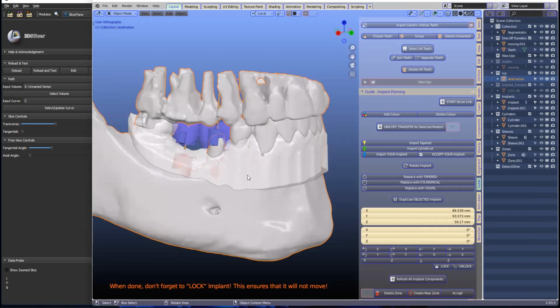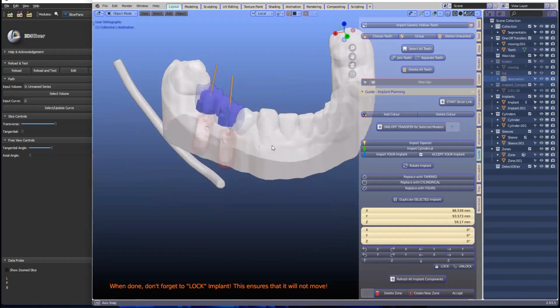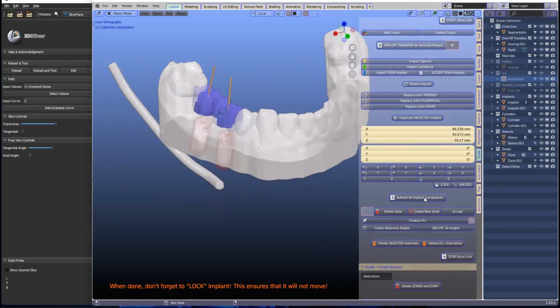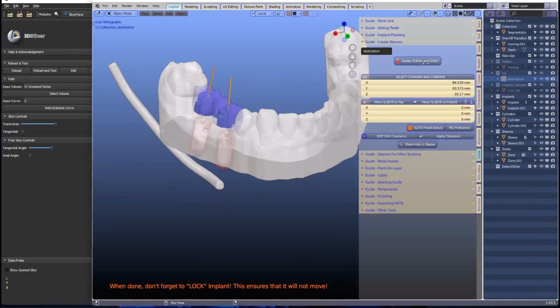Can you just maybe color code some of the models now, Michael? Yep. So we finish with this menu altogether. I'm going to go to the next menu here.